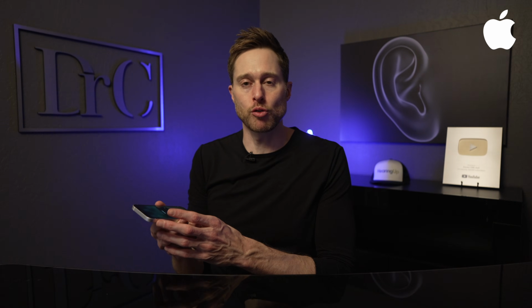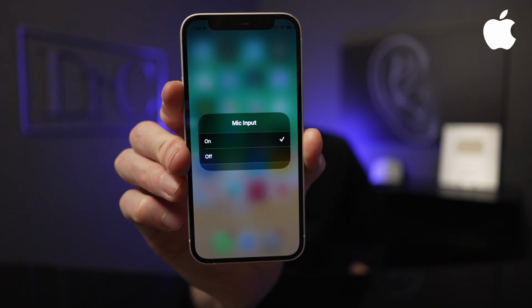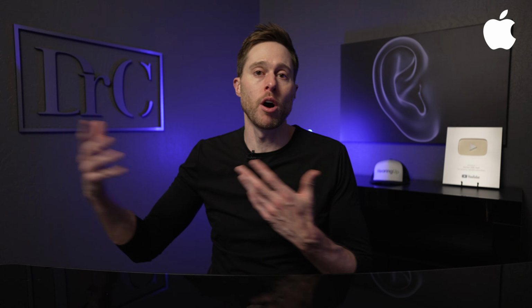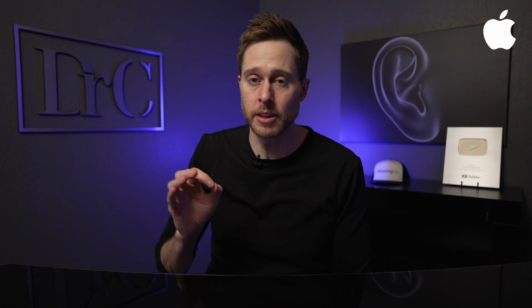This means that when I'm talking on the phone, I get to have the stream of audio go into the hearing aids themselves, but I use my phone to talk into. This is really helpful if you're in a noisy environment. However, if you want to be completely hands-free, you toggle this mic input back over to on. Now you can leave this phone in your pocket. You can even walk away from it for a certain distance, and the hearing aid microphones are picking up your voice to send to the person on the other end of the line.